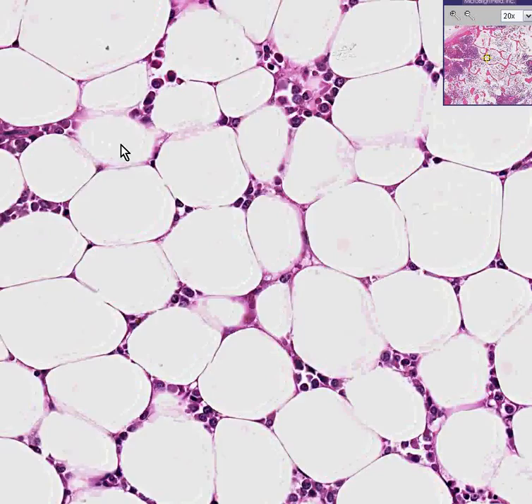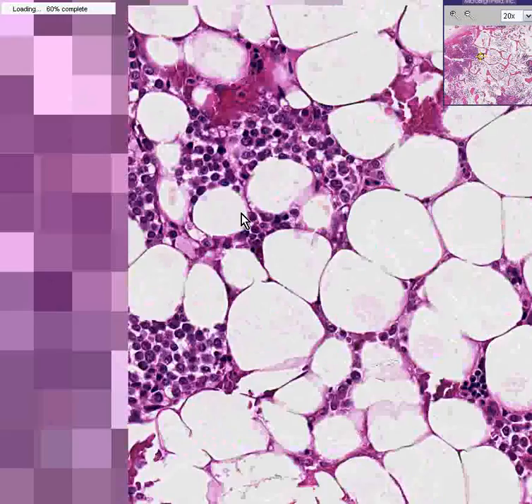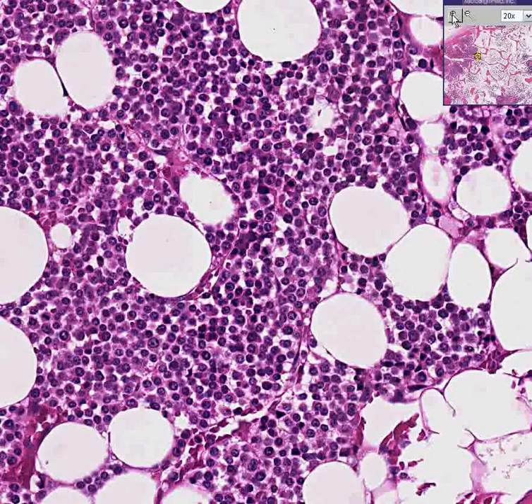As you go towards one of those lytic areas, however, which we are now, and you were to pull out the textbook of what a plasma cell should look like, you could see that about 90% of these cells are plasma cells. There's about 3 or 4 classic features to a plasma cell.